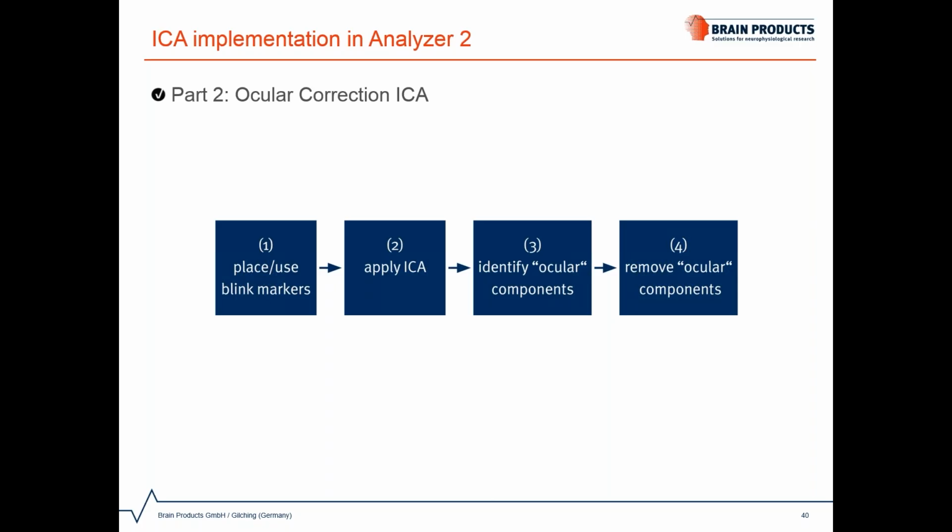This is a specialized version of the general ICA transformation, which identifies and pre-selects components with time courses that are potentially associated with eye movements and blinks. So if your goal is to use ICA just to remove ocular activity from your EEG data, you can follow this pipeline here. Everything we learned about the algorithmic options stays the same though. Some additional steps come on top, which will make your life easier when you look for EOG artifact components.